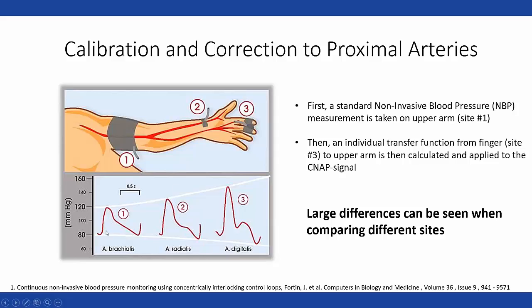And then finally here on the bottom, we can see the different waveforms depending on what site we were taking this from. Obviously we're going to be looking at a waveform that looks much like the number 3 here.